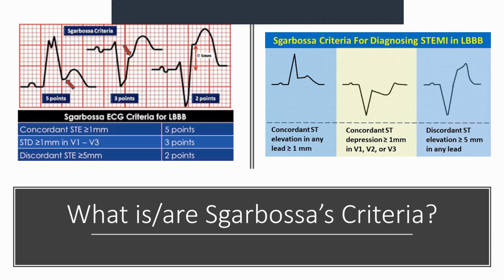The good part about treating a patient as though they have a myocardial infarct is that the worst that can happen is that you are going to either thrombolyse or catheterize a patient who during the angiogram would show not to have a blockage. Just so long as you've gone through all your indications and contraindications, relative contraindications, your patient will be relatively safe. Okay. But an MI can kill them. All right. So here we see again, you've got concordance, so QRS complex up, ST up, concordance.